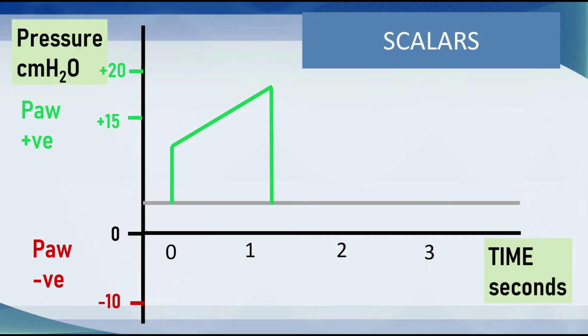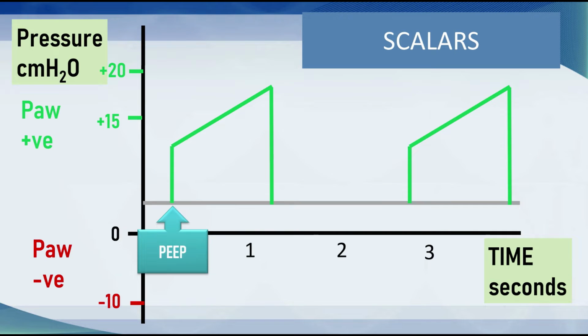As you can see, the pressure waveform goes up very rapidly to a peak pressure level. So we start here at PEEP, and we keep going until that peak pressure level. And that's a standard shark's fin, volume control, volume cycle breath.